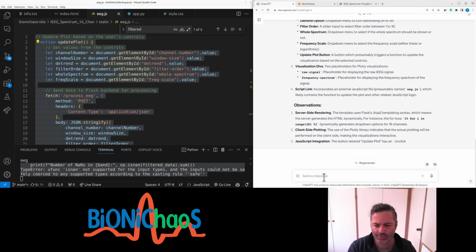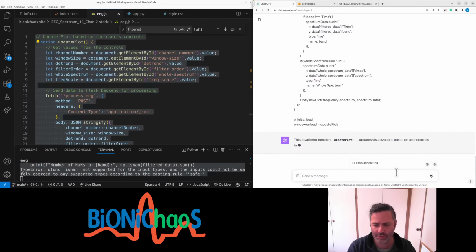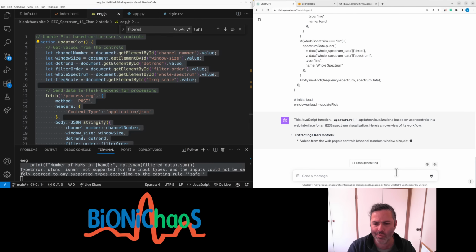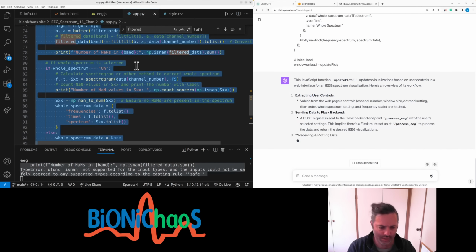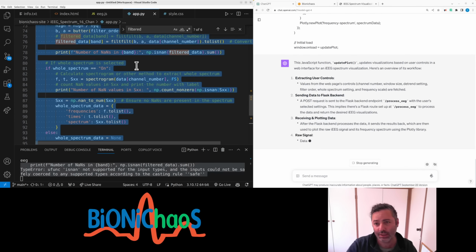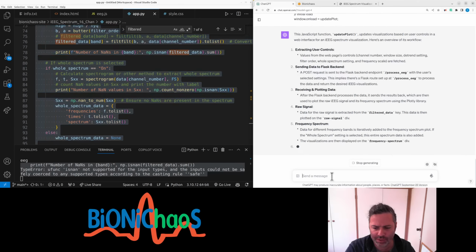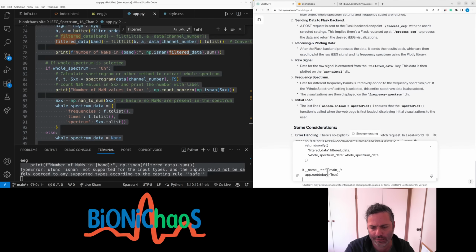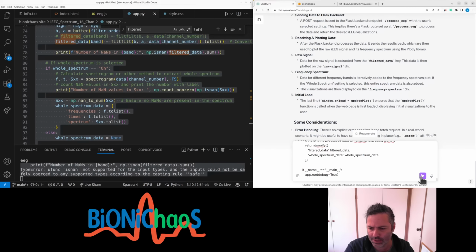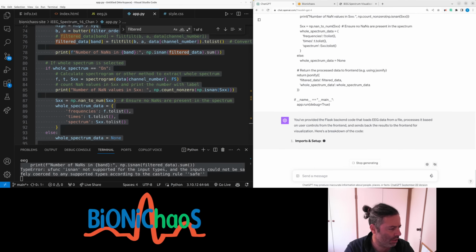Okay, that's enough. And this should be the JavaScript. It's mainly for context, because we're trying to actually solve specific errors that we're getting. Okay, that's enough. And that's the Python code. We'll just let it run.